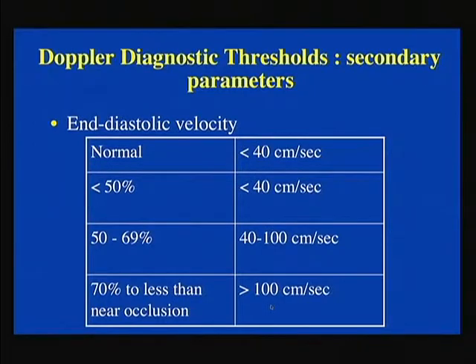And with that, we've kind of completed our case review, giving you a perspective on what the basic approach should be. The fact that when you use your velocity criteria, you try to be as consistent as possible with what you have listed in your lab manual. And starting from there, you qualify the case to make sure that you don't burn your bridges.